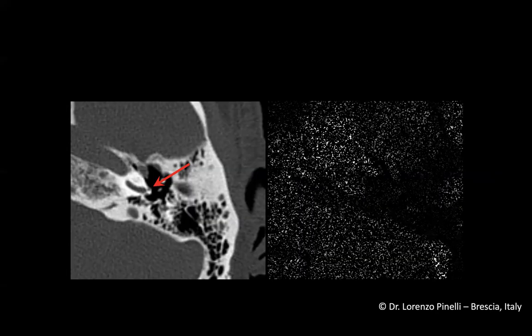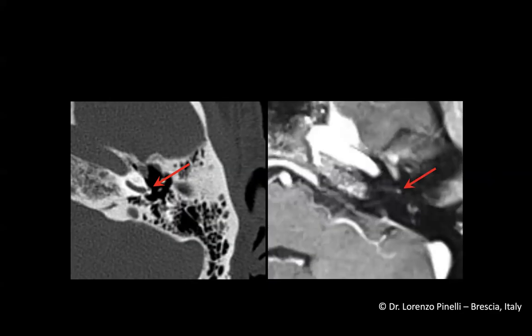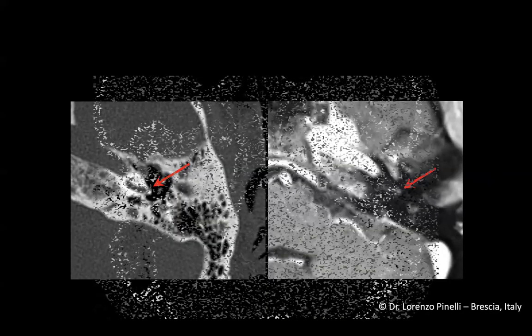Remember that sometimes you have extra vessels. Most of the extra vessels you see are aberrant veins in the otic capsule. Sometimes, like in this case, it may be an artery. And it's very important, whether or not you can visualize that or whether or not there are associated abnormalities, that you look at the skull base. This was visualized also post-contrast.